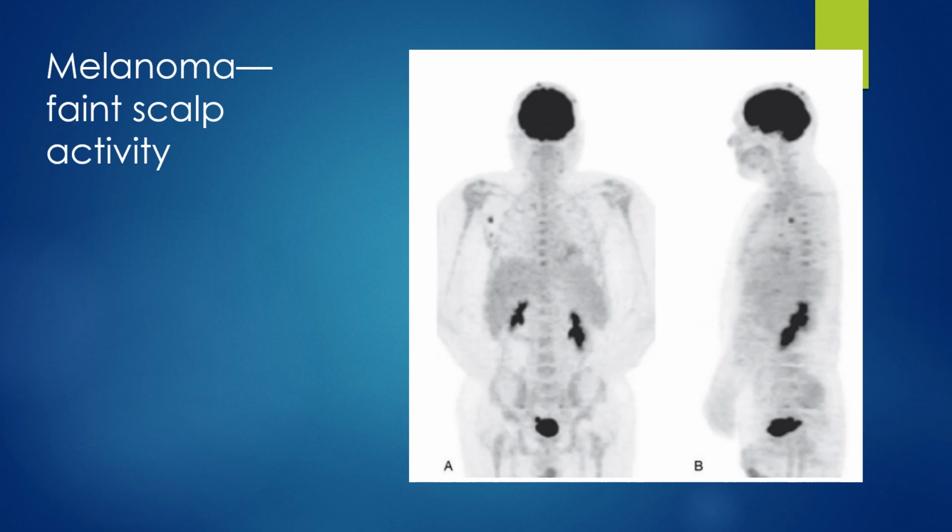Now, this is another example of melanoma, but this is in the early stages. This says faint scalp melanoma with metastases present on both coronal and sagittal views. In A, there is also right axillary and posterior mediastinal metastases. There's faint skin surface metastases that may sometimes be missed with attenuation correction protocols, or if there's a slight misregistration. But I'll point it out to you here in the scalp. You see right there on the sagittal and coronal, you can see it. You also see it right here in the axilla area on the right, and then the mediastinal area right here where my mouse is circling.